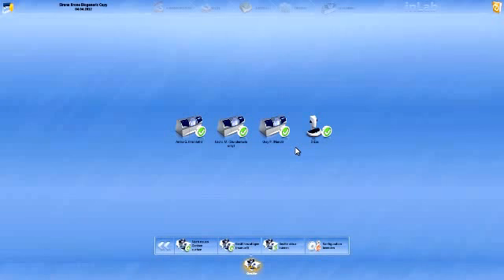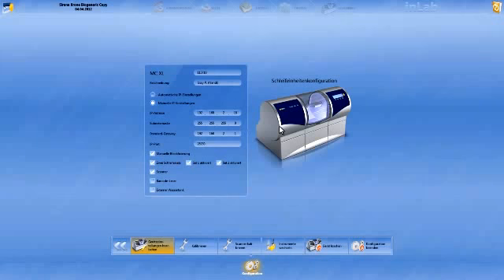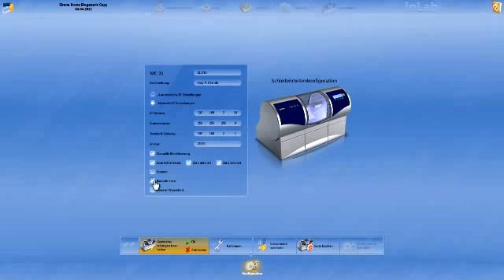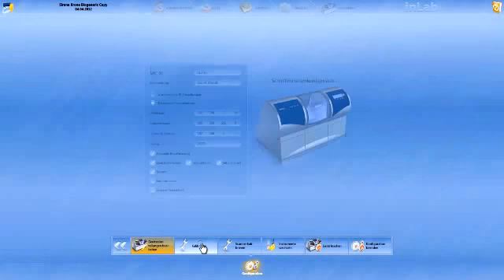I now also have the option of setting up the MCXL, entering a new name here, activating manual block fixation, activating both burr sets, the internal scanner, or the barcode scanner. I can calibrate my MCXL as well as burr sets 1 and 2 under calibration.